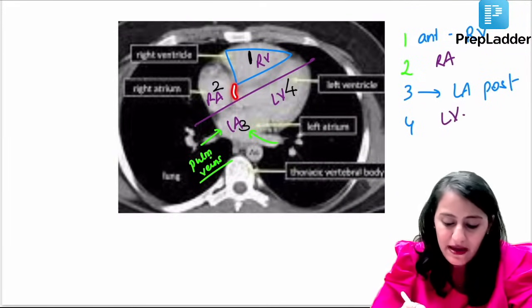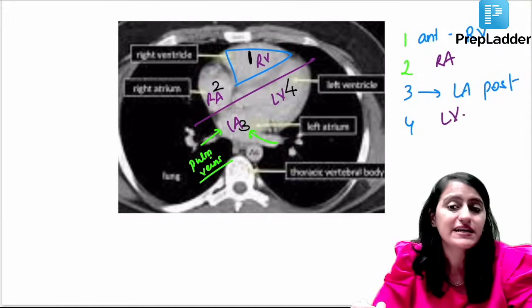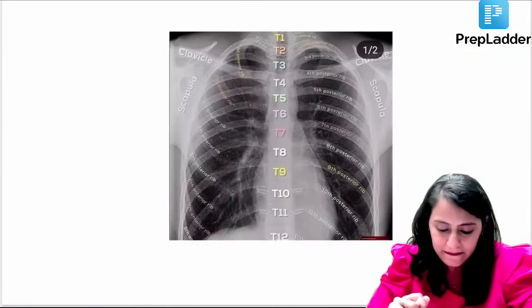You will say that ma'am only discussed the heart chambers, but the exam asked this. Think logically. In what chamber is it connecting? Left atrium, so it's going to be pulmonary vein. Okay, that's going to be pulmonary vein.